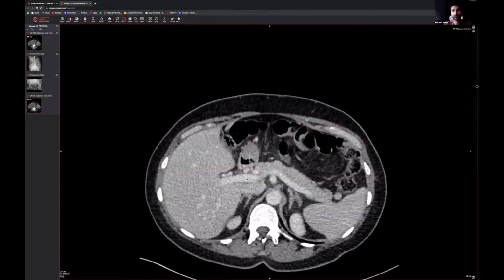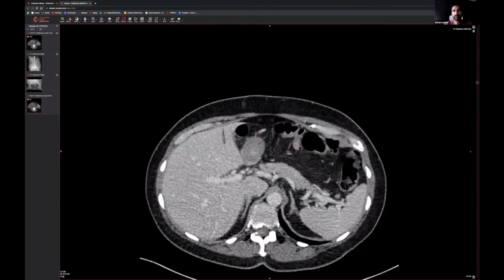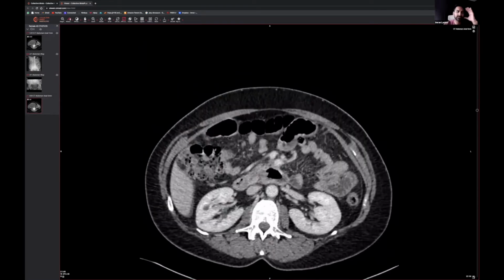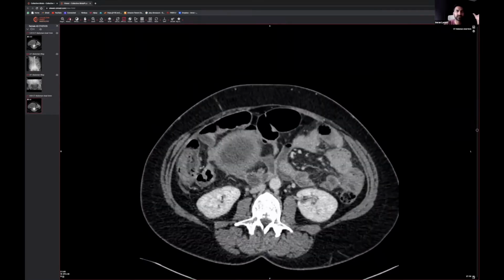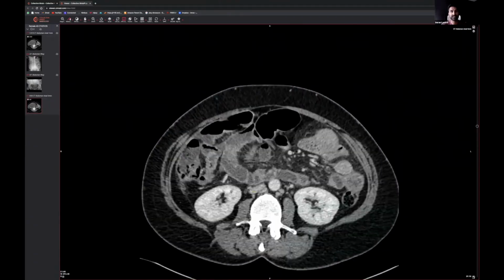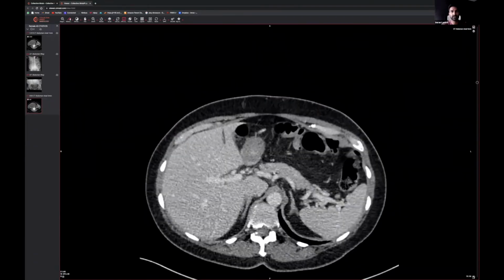Right, the other thing that can be causing abdominal pain is going to be the pancreas, but the pancreas, this fluffy looking thing sitting right down the center of the abdomen, looks completely normal as well. So that doesn't look like anything to worry about. And remember, we're saying, could this be a renal calculus? So we're looking to see whether there's any evidence of hydronephrosis, which would look like Mickey Mouse hands, but this doesn't look like a Mickey Mouse hand on either side. Both kidneys actually look pretty normal. And the ureter, which is sitting over here, looks fairly normal as we scroll all the way down.